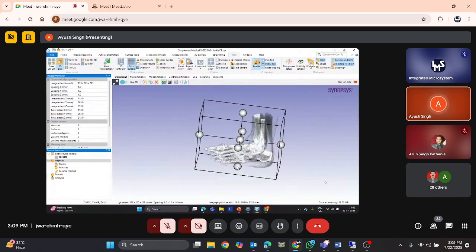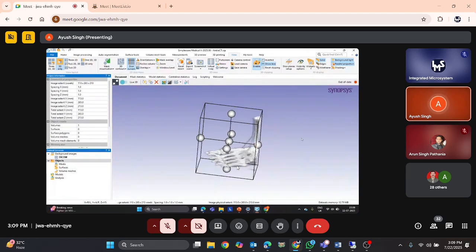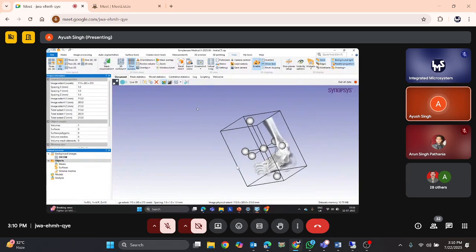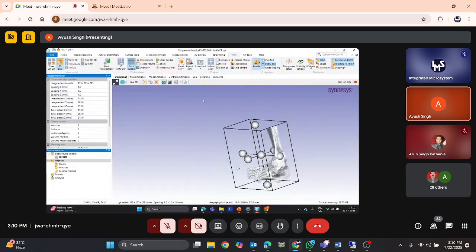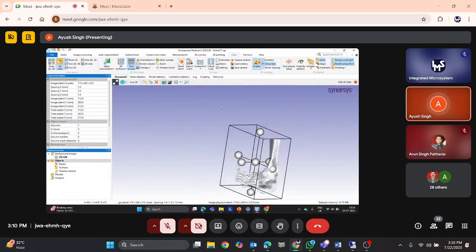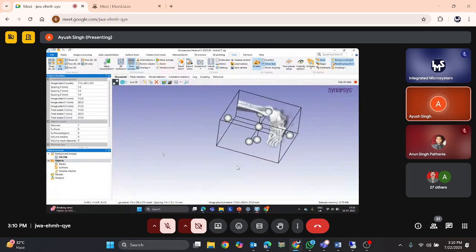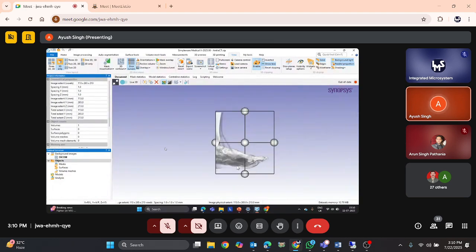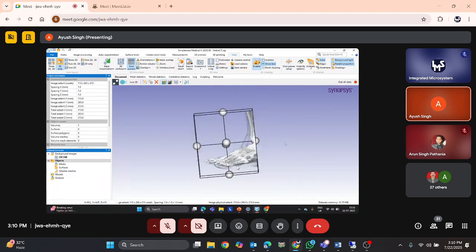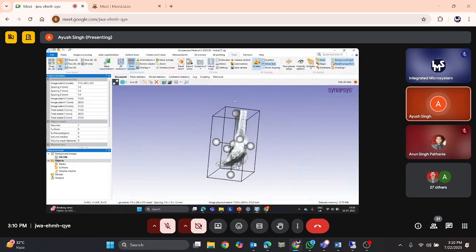So if we need to clip directly within the dataset itself, we can clip in and see the new features also. Then we can rotate it along the central axis just by pressing Control followed by the left button on my mouse. I can rotate it along a central view. I can realign the structure in any view of my liking. It's a very easy process to align my view, just realigning one direction to view it more clearly.